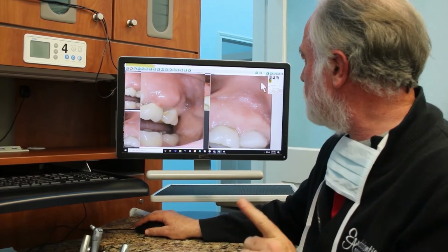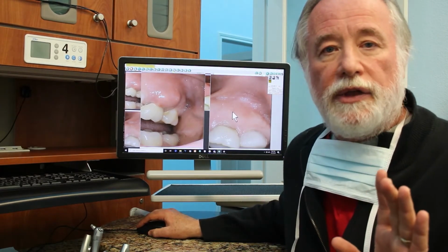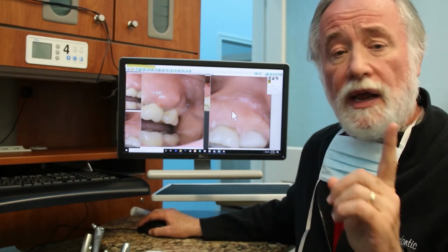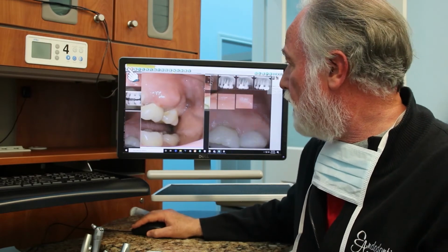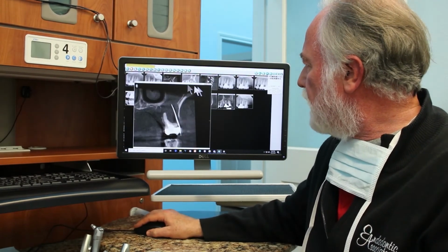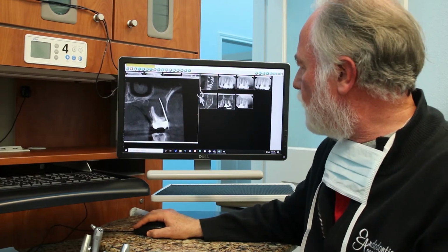And then there it is again, kind of looking at that same angle, so you can see how all this is resolved. Now, this was actually just taken recently, so as to see how things have progressed, and now this is maintaining itself. Let's take a look at what's happened with the bone, though. That's what's phenomenal. That's what's so cool. So recall we had this big old infection up here where it was tracing. Let's pin that on our board here.